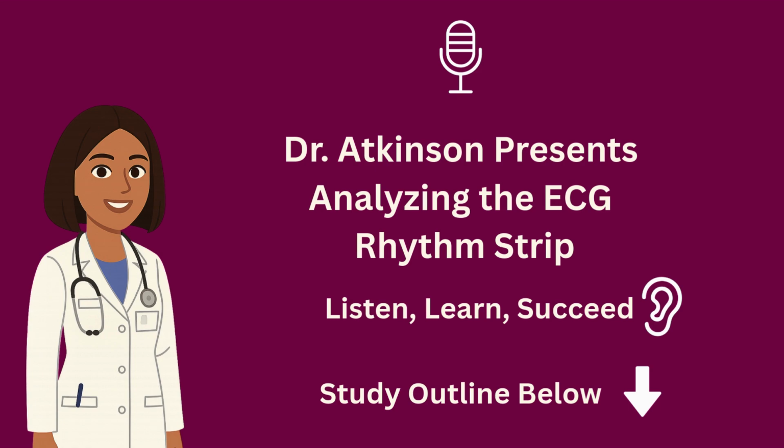If the rhythm is irregular, we use a different approach. Count the number of RR intervals in 6 seconds, then multiply that number by 10. Remember, the ECG paper is marked at 3-second intervals across the top, 15 large boxes. By using 2 of these intervals, you have 6 seconds. Counting the RR intervals rather than QRS complexes is more reliable because counting only the QRS can sometimes make the rate look higher than it really is. The same methods can be applied to the atrial rate, but in that case you measure the PP interval instead of the RR.